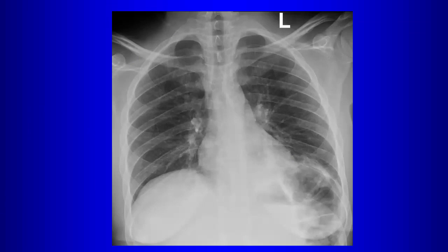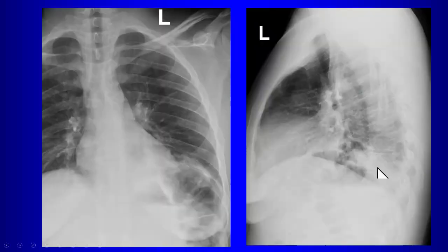Okay, this case? Retrocardiac opacity. Yeah, so there's retrocardiac opacity, so what are you suspecting here then? Left lower lobe, diagnosis, pneumonia, right? Patient has cough, fever, or whatever. Left lower lobe pneumonia, you'd be suspecting. Now, does the lateral view help you? Yeah, the spine sign. So, the findings on the lateral view for the lower lobes.